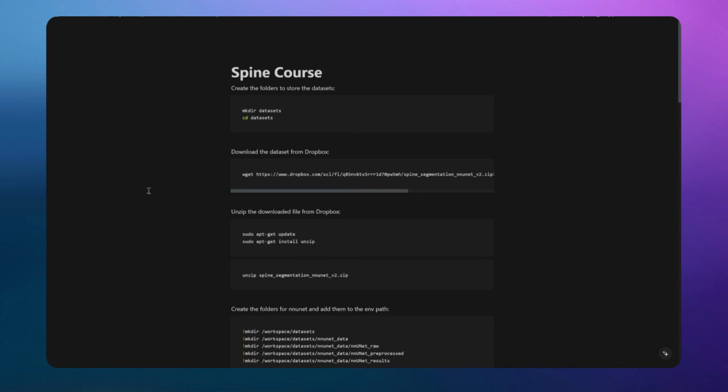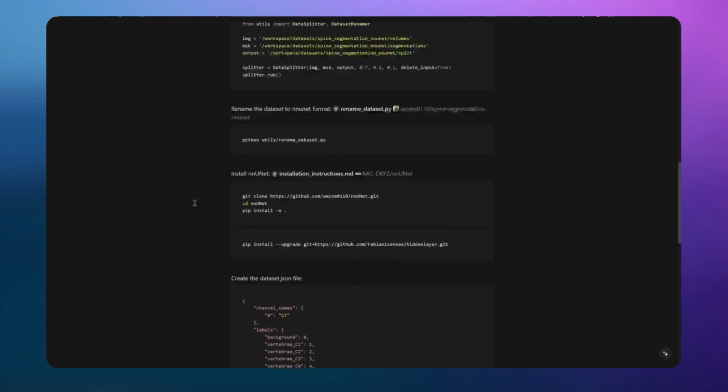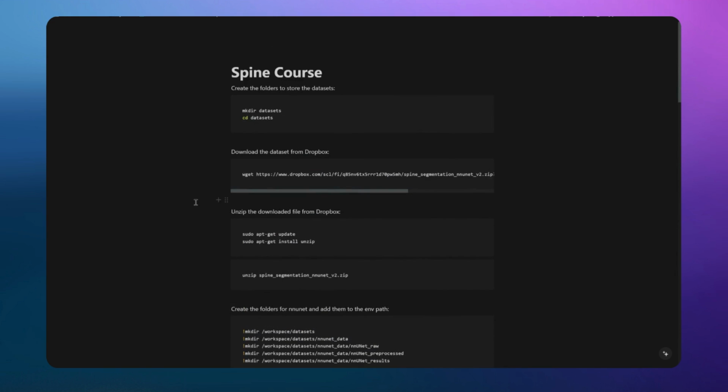So this was the introduction of what are the steps that we will see in this video. And as I said, I will share this with you if you prefer after the video. And we'll do the steps. Some steps we can write some code if necessary, and other steps we'll just run some existing code. And if you have questions, you can always leave them in the comments.